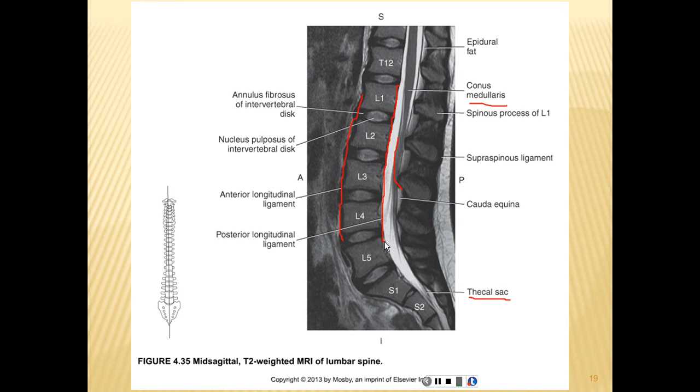And as far as lines, the radiologist looks at this anterior line, the posterior line, and he or she looks at the spinal laminal line and the line of the spinous process. Those are the four lines that the radiologists look at to understand if there is indeed pathology to the L-spine.